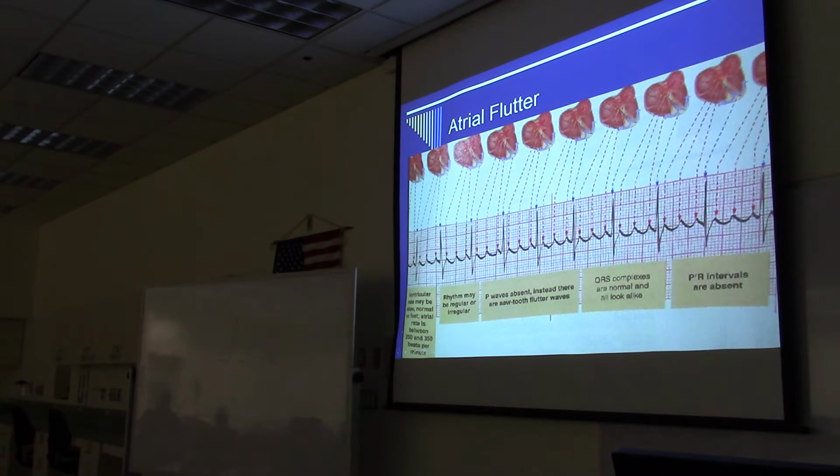But what about the ventricular rate? It could be slow, normal, or fast. And we're looking at a 6-second period of time. So how fast is the ventricular rate on this tracing? 100? Yeah, you counted 10 multiplied by 10? Yeah, about 100.